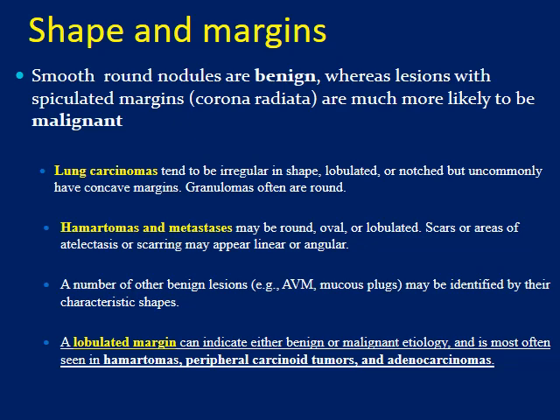So as you see, there is no 100% feature that can tell you that this lesion is benign or malignant. But the idea is that you gather all the signs together. For example, you have a rounded lesion, it contains fatty density inside, there is no spiculation, there are no lymph nodes, the patient is not complaining, so it is more or less toward benignity.